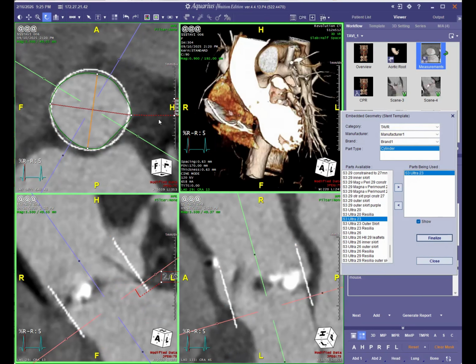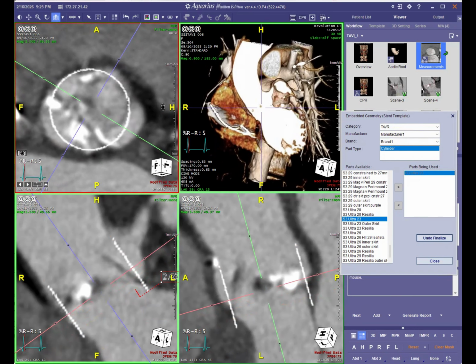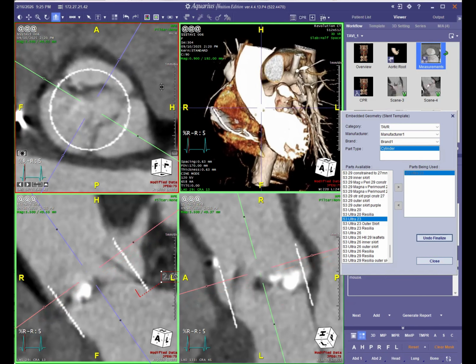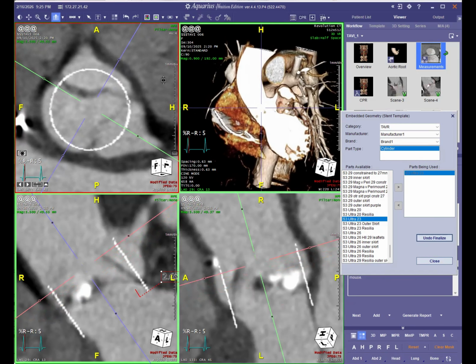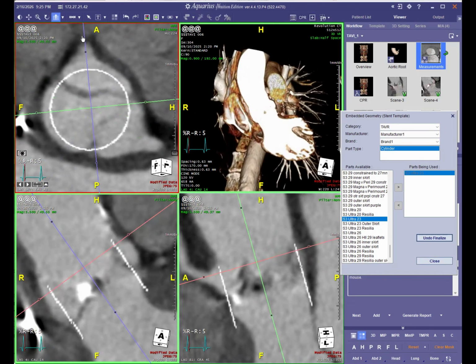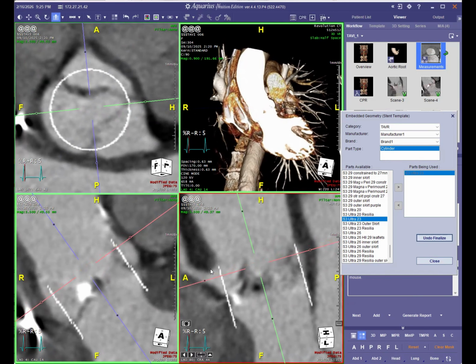I don't need to know what my left main VTC is because we already know that the cusp height was less than the coronary height for the left main coronary artery. We're going to look at this RCA very closely though, because of the cusp height being higher than my coronary height. So I'm going to scroll down until my pink line is in the center of the ostium of the RCA.